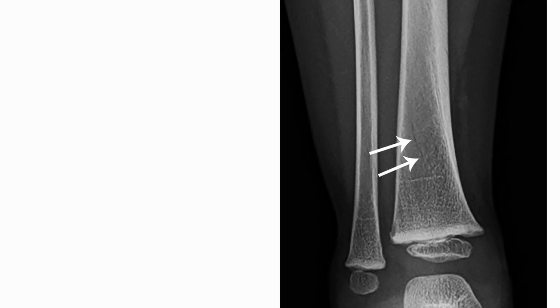A similar thing is this one, which is a toddler's fracture. You may not see a fracture, but the child is not weight bearing and is extremely tender. You put them in a long leg cast and get them seen in fracture clinic where they will x-ray them again in 2 weeks' time.